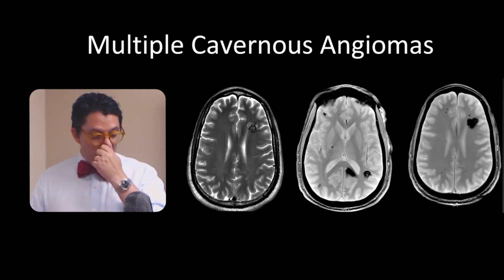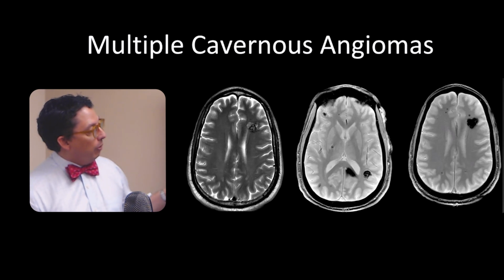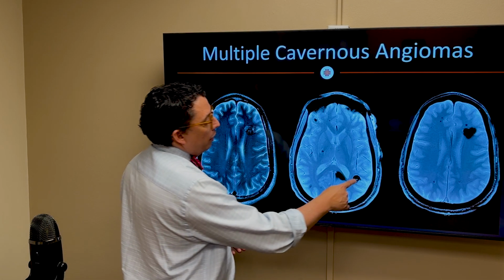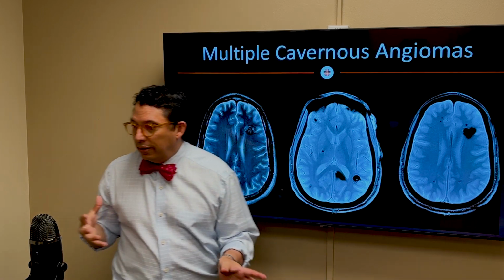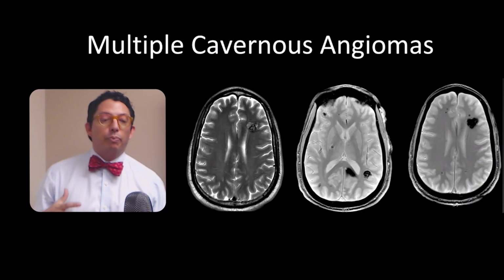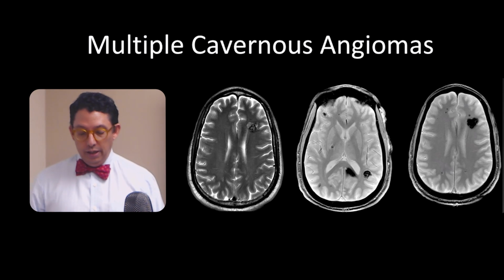They're typically subcortical. But in the case we just saw, when we did the MRI and we did susceptibility, all of the lesions look like little popcorns. So this was not a diffuse axonal injury. This was actually a patient that had cavernomas. Again, that was the oddball.